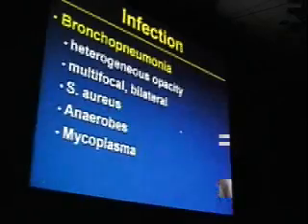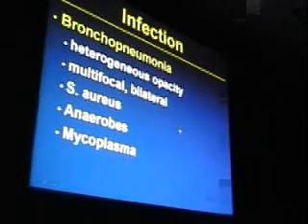But here we have multifocal areas of airspace opacity. In the setting of cough and fever, this significantly narrows the differential. This is more typical of the so-called bronchopneumonia. These are typically more scattered areas of airspace opacity. They're typically multifocal, often bilateral.